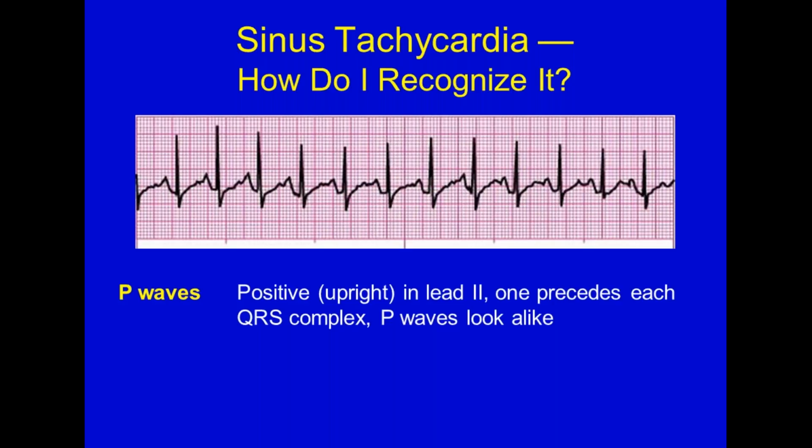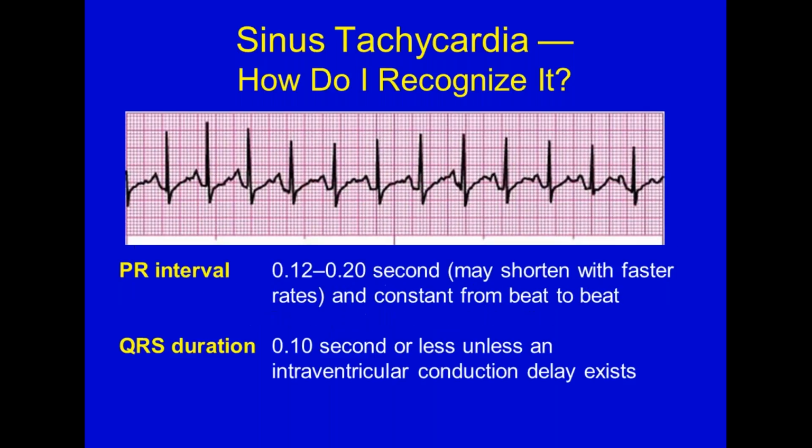If it's that part, it should be automatic because it's going to be firing off a lot faster. Right, but we'll see when we get into the ventricular rhythms. We'll get some wide ones that go really fast, but they're knocked right up against each other pretty much. So you don't really have T waves or P waves. You just get what looks like triangles, essentially. And we'll see those as we get going here.